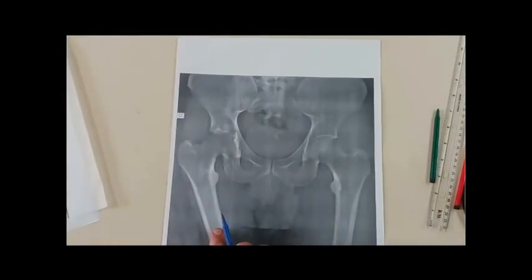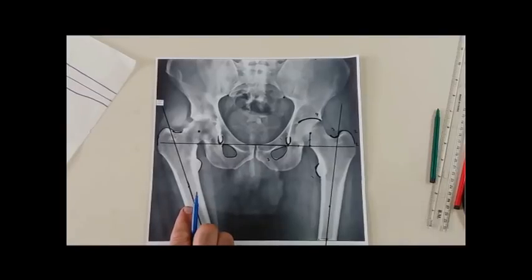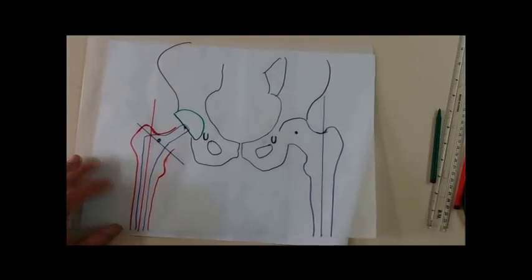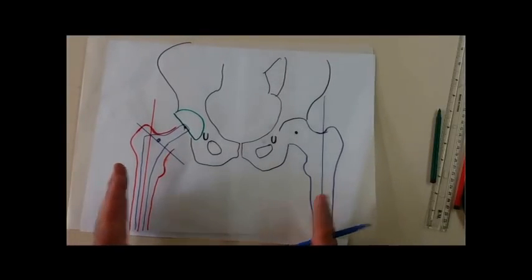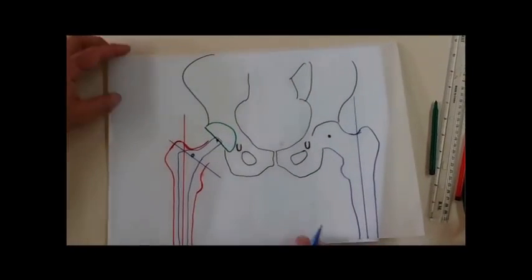This one is the adducted hip. While we transfer, this is also the same picture, templating. This was the adducted hip. This tracing paper is neutral, both femurs. By doing this, I can fix my results. What are the results to be judged from this templating is the following.